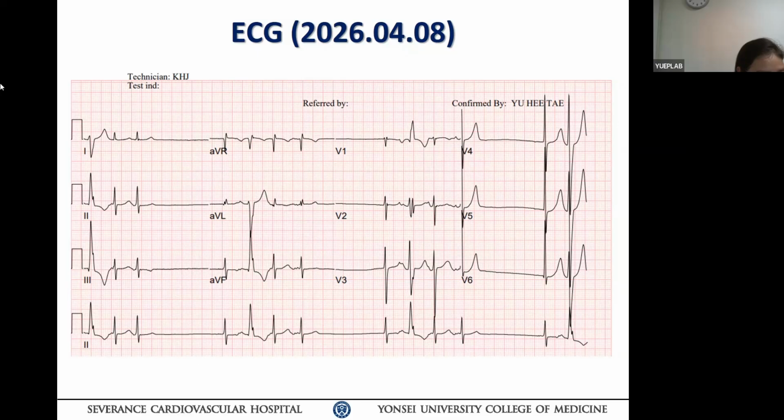The patient had a long sinus pause of about 2 seconds. Use the mouse.